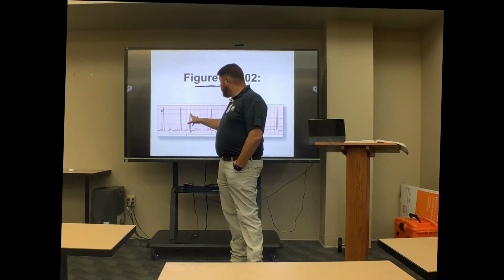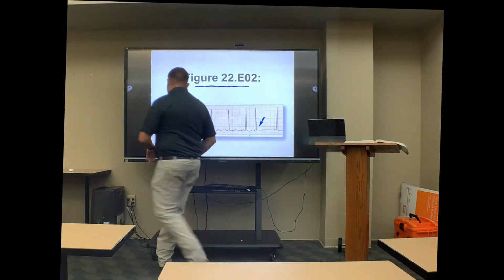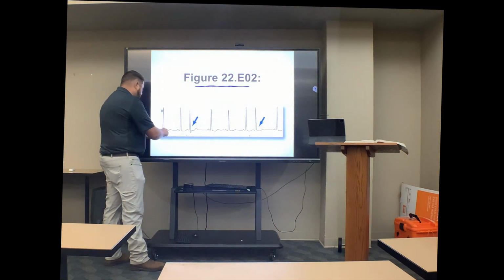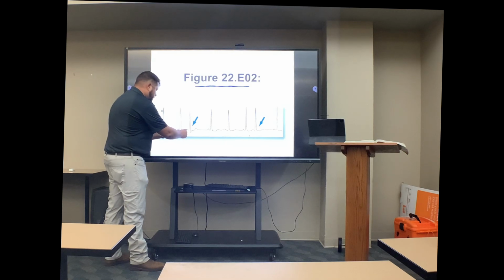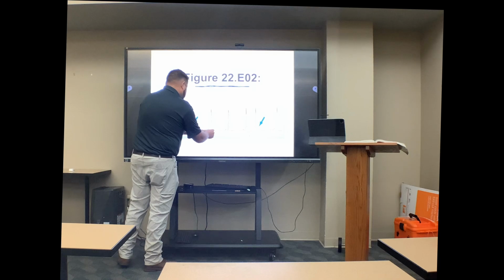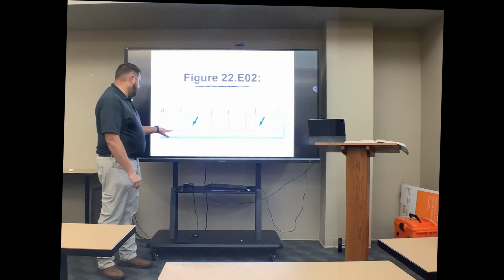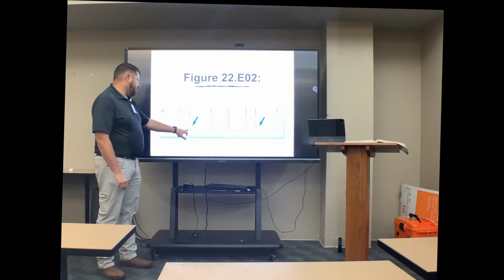And if I look at my QT interval there, I know we haven't talked a lot about that, but it's going to be the same as that one. So that tells me that is.